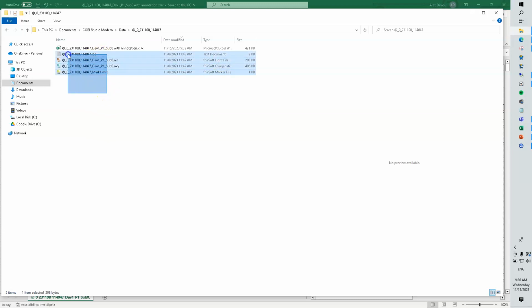It always contains these 4 files. This is an additional file that I created, and I'll explain that in a second. What's most important is that all these files are actually CSV or text files. They can be easily opened.